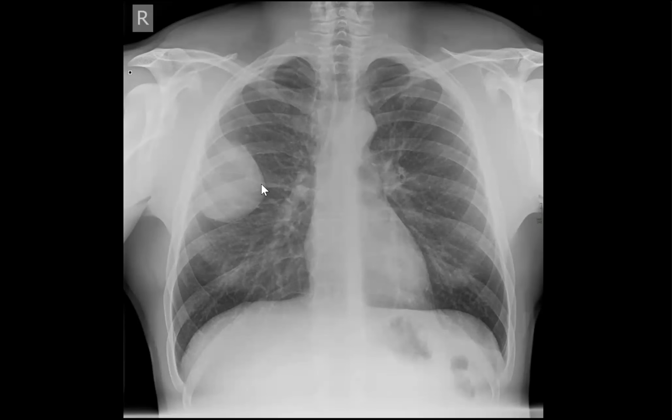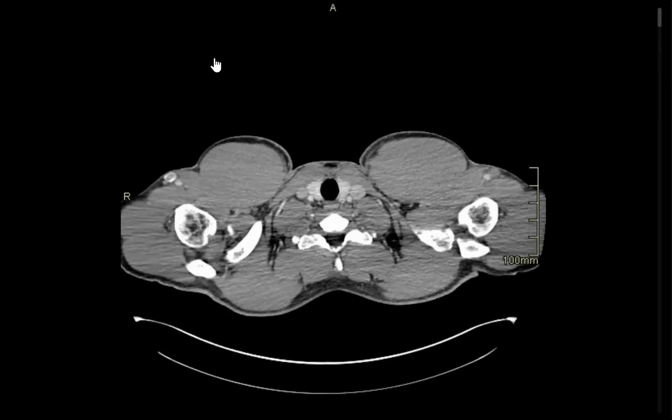So this lesion is relatively well defined, broad based to the right lateral chest wall, and appears to be non-aggressive. Well defined medial border, and the lateral border is merged with the chest wall, with incomplete border sign suggesting an extrapulmonary lesion. Yes, incomplete border sign. Proceed with the contrast enhanced CT scan for further evaluation.